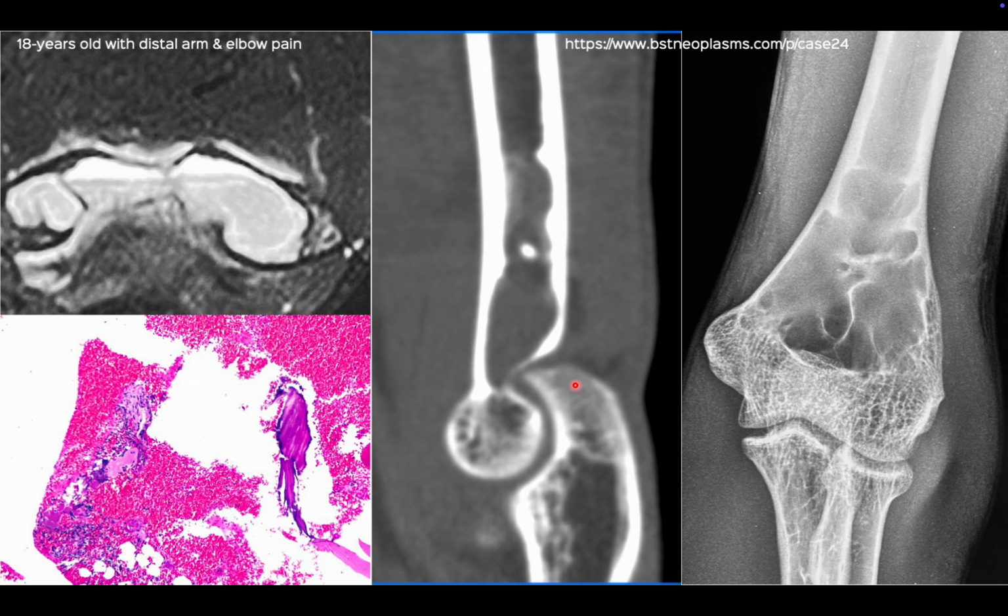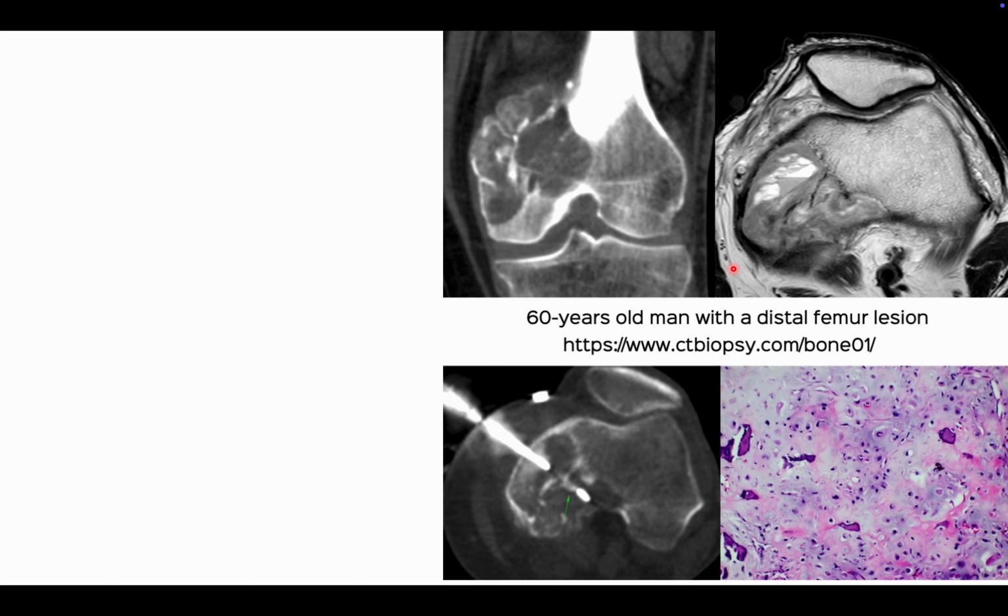I think the commonest issue occurs with aneurysmal bone cyst because that also presents with fluid levels, but, and I'll discuss this later in the piece as well, the fluid levels pretty much involve the entire lesion, and they don't get broken up and you don't get solid elements within. And we discussed this as case 24 here. You can see this beautiful distal humerus ABC.